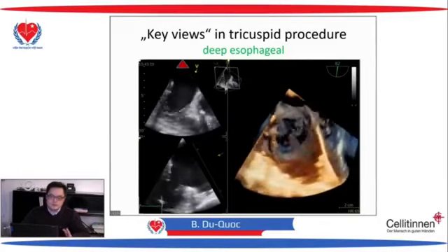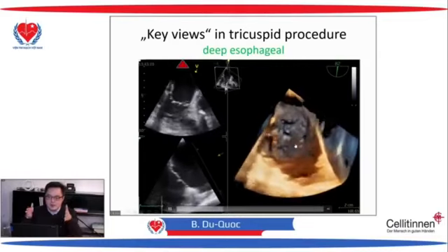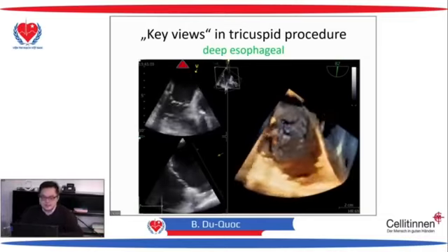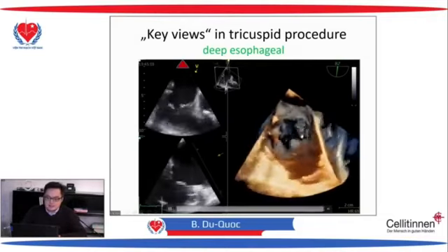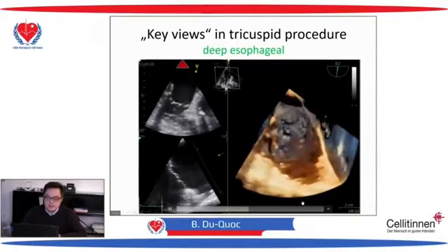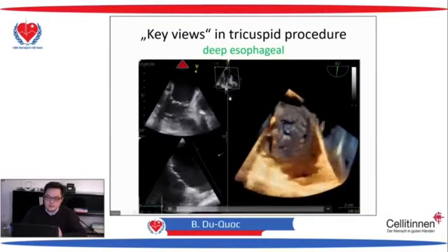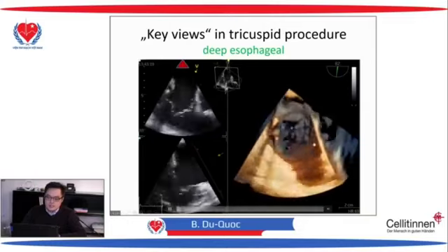Now, one problem is when you do 3D imaging with a narrow volume sector. This is difficult for beginners to detect the cusp, and the question is, what is the septal, what is the anterior, and what is the posterior leaflet in this position? So I told you about the landmarks, and first of all, here is the top of your volume size, so this must be somewhere in the posterior. So this is the posterior region of the anatomy, and here you see the septal.